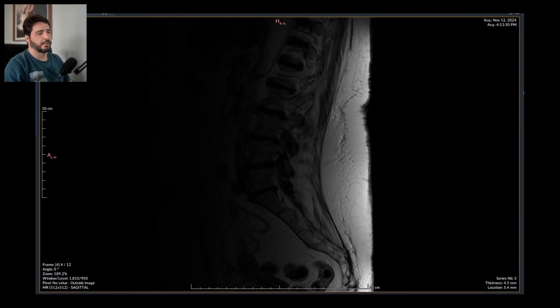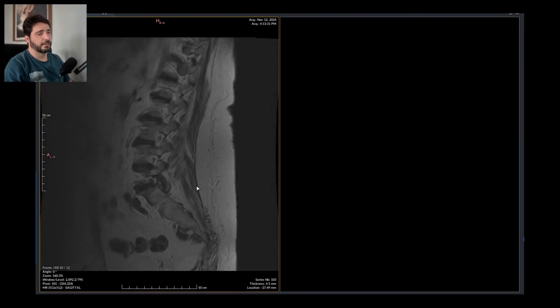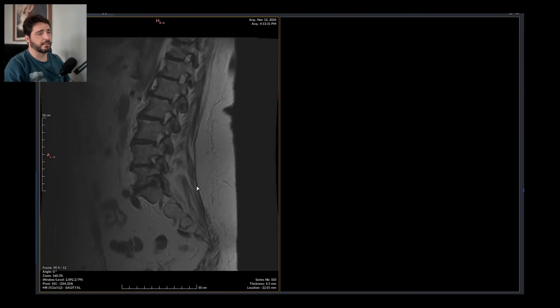This is a 65-year-old female, and it says nothing. Let's just see if we can. It says she has some lumbar disc disease and vertebral canal stenosis. Oh, it comes from the same place as that previous scan, so it's a very badly done scan, just as crappy as they come.